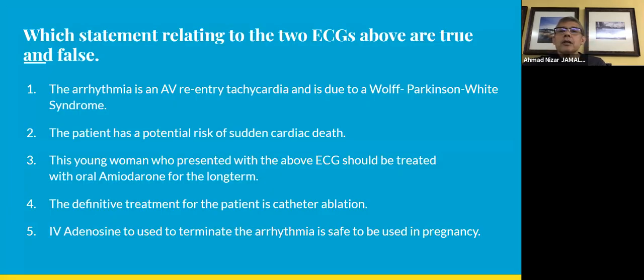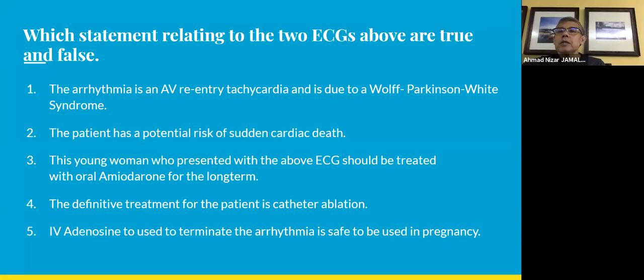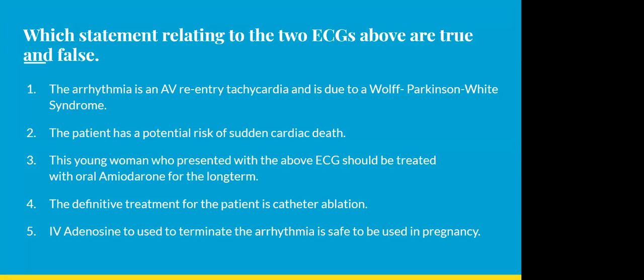So the patient has a potential risk of sudden cardiac death. Yes, she has. True. This young woman who presented with the above ECG should be treated with oral amiodarone for the long term. False. The answer is false because it's a young woman.